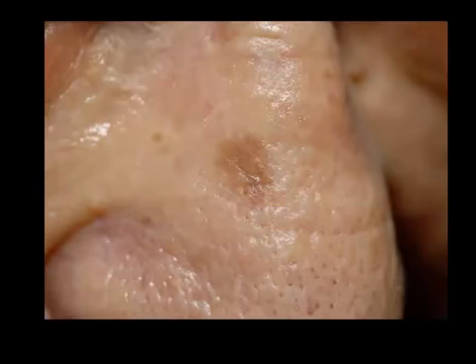Of course, you may also see a pattern of dots, like in this case, and the dots may be arranged around the follicles. This could be a solar lentigo with regression that we call lichen planus-like keratosis. This could be melanoma in situ, or this could be pigmented actinic keratosis. If there are no circles, it does not exclude melanoma in situ on the face, but if there are circles, it's a good clue to melanoma in situ.